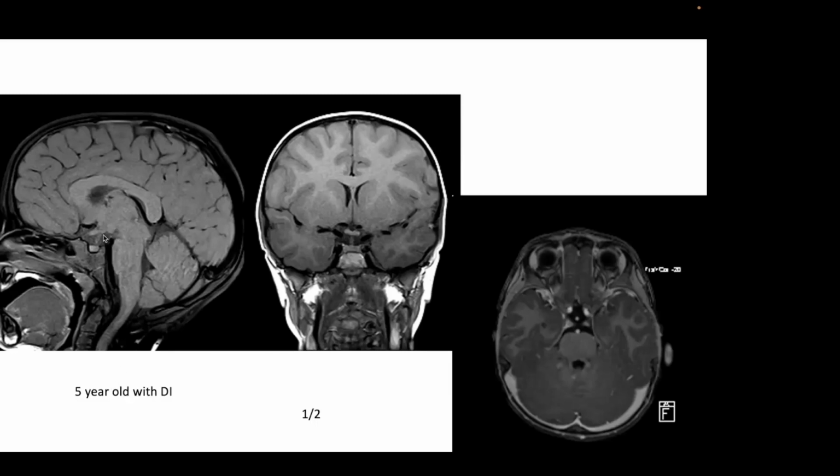The patient had this imaging, which shows a normal infundibulum. If the patient has central diabetes insipidus, you want to look carefully in the hypothalamus and stalk. Here's the optic chiasm, there's the stalk, normal enhancement. The one point I want to make about this case is that in a child with diabetes insipidus, even if the scan is normal, you should bring the patient back in a couple of months to re-image them, because frequently the symptom of diabetes insipidus will precede the structural abnormality.